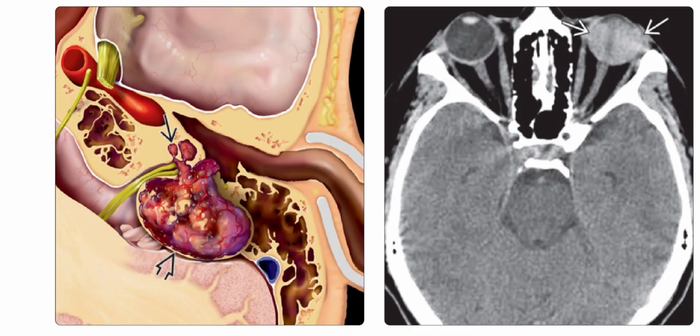So left is the axial graphic, which depicts an endolymphatic sac tumor in a patient with von Hippel-Lindau syndrome. The lesion is a lytic vascular hemorrhagic mass that lies between the internal auditory canal and the sigmoid sinus. Note the tendency to fistulize the inner ear. Right is the axial non-enhanced CT scan in a 51-year-old female with known VHL and sensory neural hearing loss.